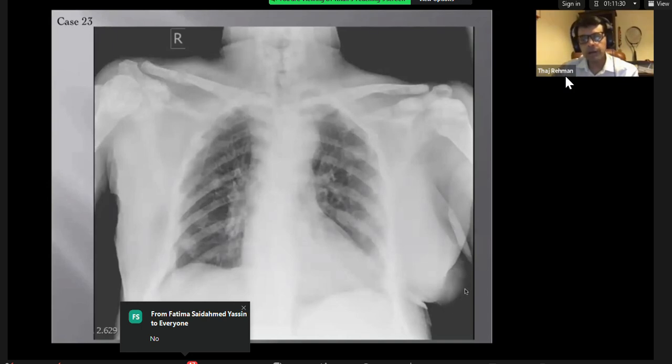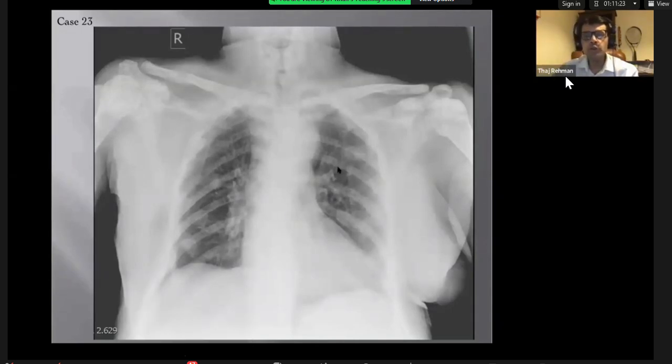You can't, because a breast mass lesion is inside the breast, and unlike a lung mass or lung nodule, there is no air surrounding a nodule or mass in the breast to make that diagnosis on chest X-ray. Yeah, you can see soft tissue. That's actually the breast rotated outside.